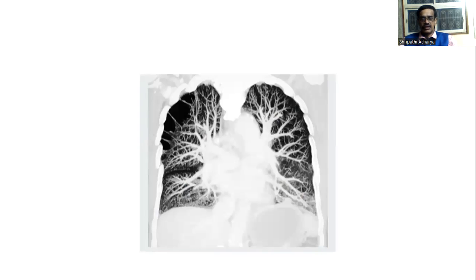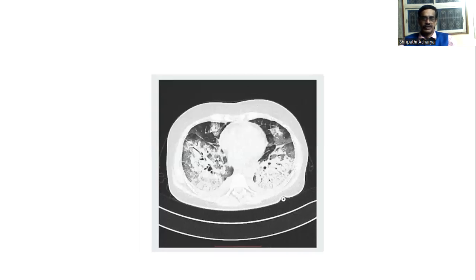Here the bronchography is pattern of bronchial tree. Here you can see some opacity in the lung parenchyma. There can be some collection of mucus.